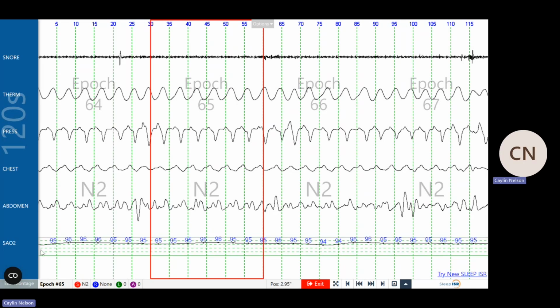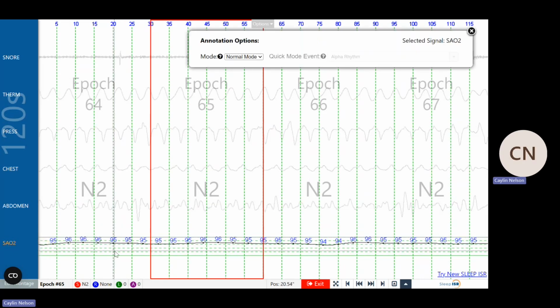So again, we're gonna look at your oxygen levels. It looks pretty consistent here. So you can see with the graphical line in our SaO2, pretty continuous. So not any changes that we can necessarily look for. So if you use that little reference line, you can see that it's pretty consistent. It peaks at the bottom at 94 and at the top at 96. So nothing very significant.